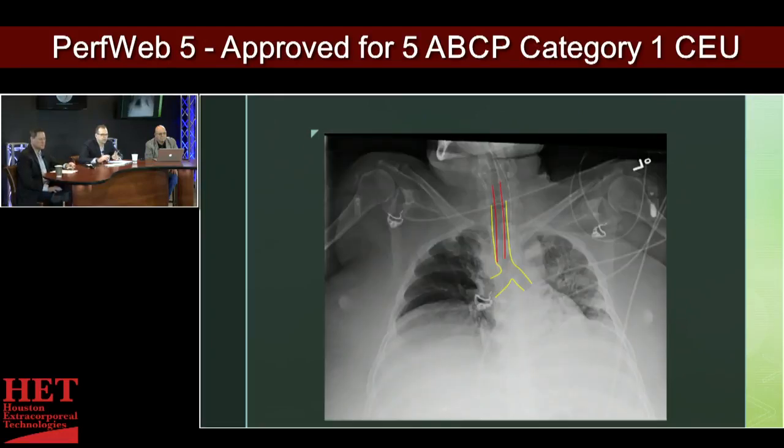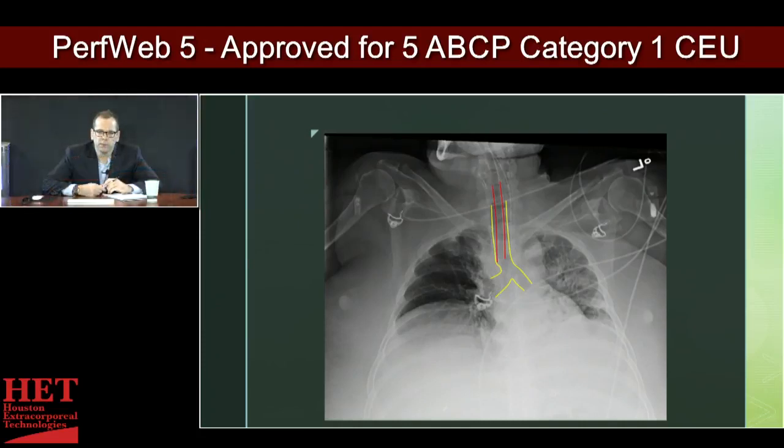This particular x-ray has a couple of different things to look at. We've highlighted here, this is an intubated patient, and the red outline is the endotracheal tube. The yellow outline is the trachea into the left and right mainstem bronchi. There are obviously multiple lines. You see the hyperlucent lines, those are the hyperopaque lines, those are the EKG leads.